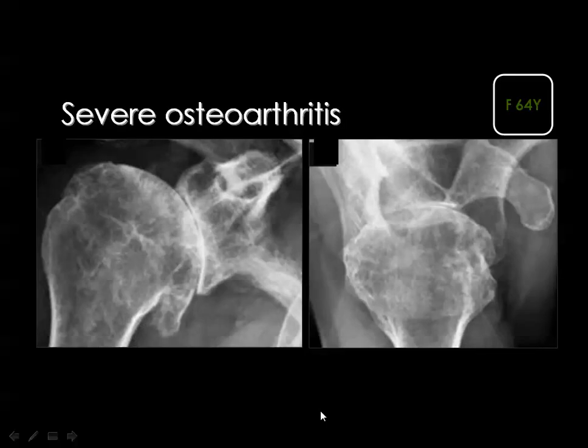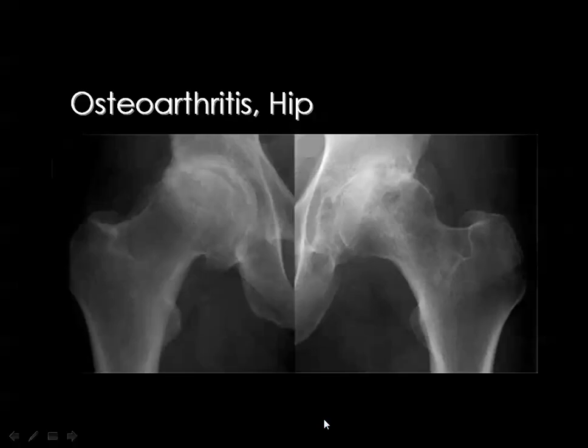And you know that osteoarthritis of the shoulder is not that common. It is usually related to previously existing disease, but primary osteoarthritis is relatively uncommon compared to that of the knee. But the same manifestations can be seen by plain X-ray: narrowing of the joint space, subarticular bone sclerosis, prominent osteophytic lipping, and there may be subchondral or pseudocystic changes.